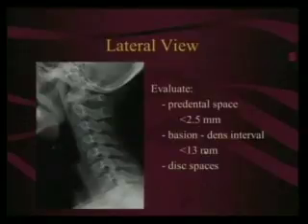One of the things that you want to do on a lateral film too, because remember we are radiologists, so we read the corners of the films as well. Look at the mandible, look at the skull base, look at the upper chest. This helps you know how rotated the patient is. See how nice and beautifully aligned this film is? And that the mandibular angles overlap each other? That means that this patient's standing straight, not rotated. Because that's going to affect how things look if the patient's rotated. And we have some examples of that coming up in a minute.